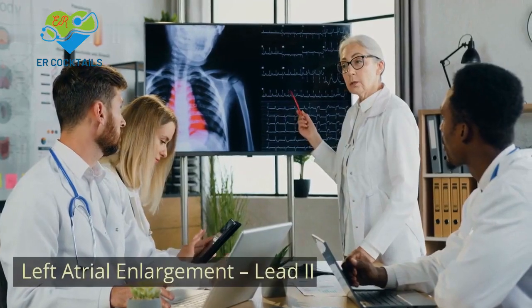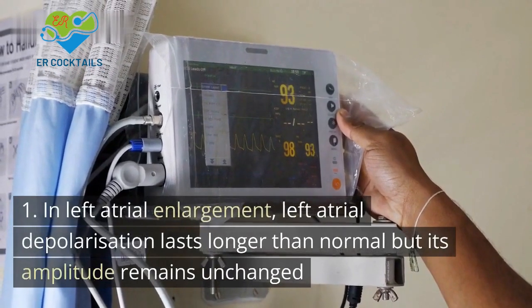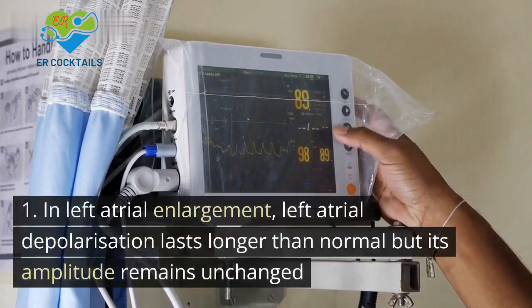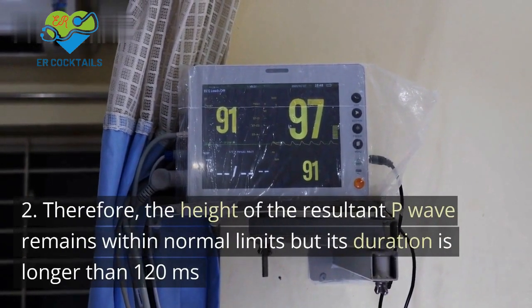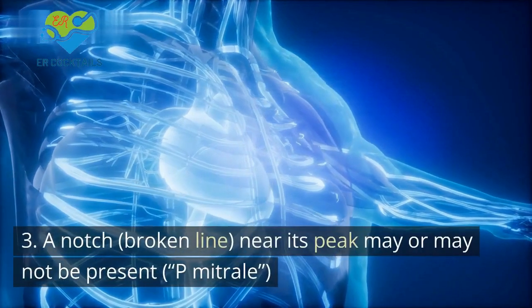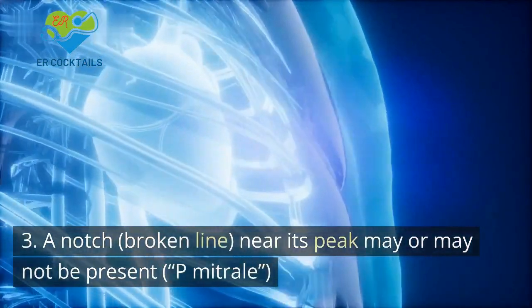Left atrial enlargement, lead 2. 1. In left atrial enlargement, left atrial depolarization lasts longer than normal but its amplitude remains unchanged. 2. Therefore, the height of the resultant P wave remains within normal limits but its duration is longer than 120 milliseconds. 3. A notch, broken line, near its peak may or may not be present, P mitrale.